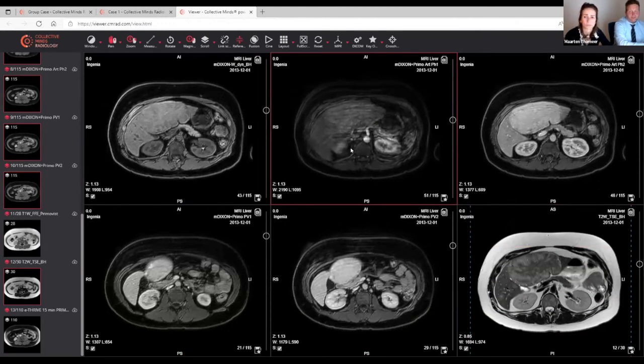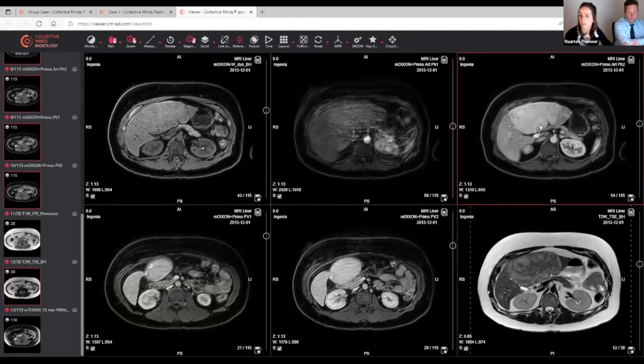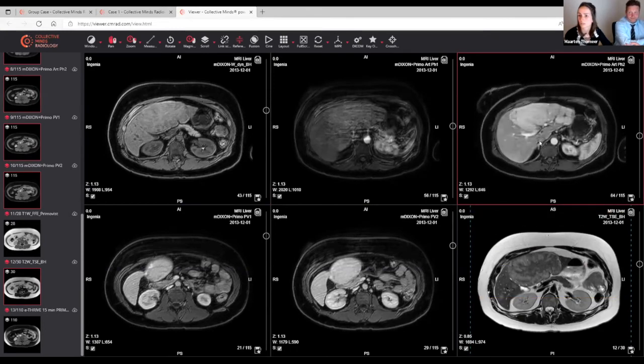That's a typical artifact due to the use of Primovist. There's a kind of breathing artifact that happens only in the arterial phase. Other contrast agents don't have this drawback. The solution we use is to use different arterial phases. So the second is also the arterial phase. By using multiple arterial phases, you're sure that one is okay. You can also use dilution of the contrast agent, but we don't use that. Okay, so that's why we have 2. Yes, 2 arterial phases. This is also the better one, because there you have enhancement of the portal tracts. Yes, exactly. So this is okay.